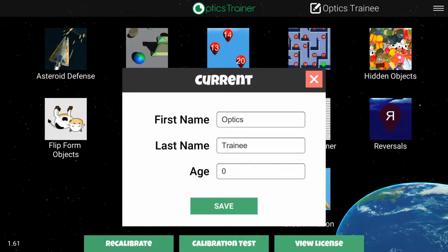This needs to be done before each session for each patient because based on how they're sitting and their positioning, it changes from session to session. So it's best to recalibrate before each time they use the software. So you'll see it begin by showing a series of dots. I'm going to stare at the dots until each dot pops, like this.